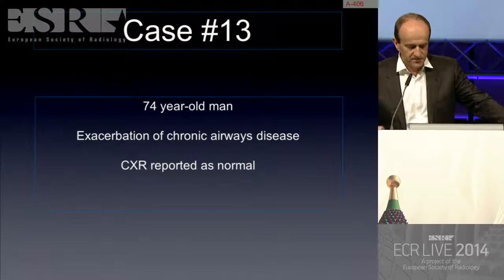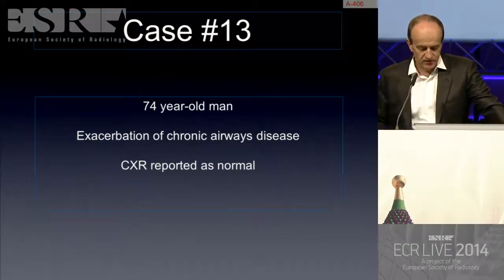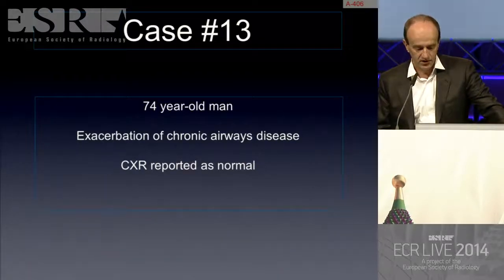Case number 13 is a 74-year-old man with exacerbation of chronic airway disease. The chest radiograph is reported as normal.